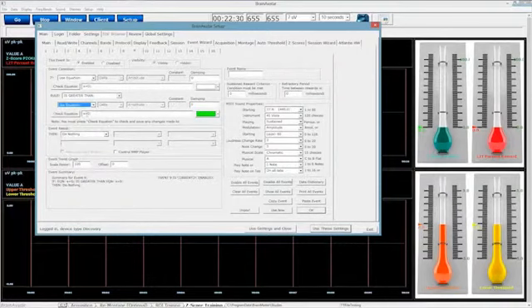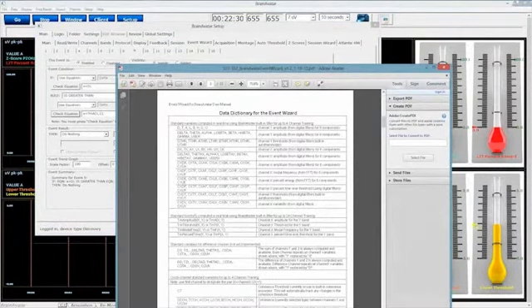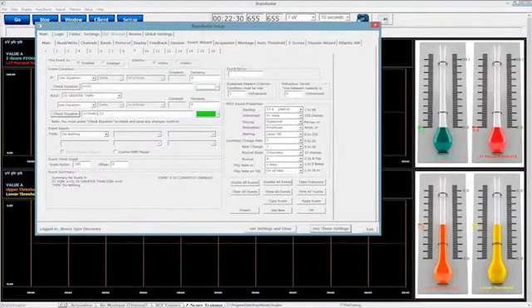Now I'm going to go right down here, and I'm going to type TRNA 1, 1. And my check equation, I'm going to see OK. So now what we know by our Event Wizard right here is we are looking at TRNA, or train amplitude. We are looking at channel X amplitude for the Y band. So 1, 1 equals channel 1 delta. As you can see, these are looking at both the exact same thing.